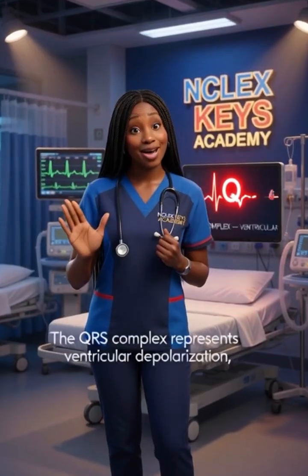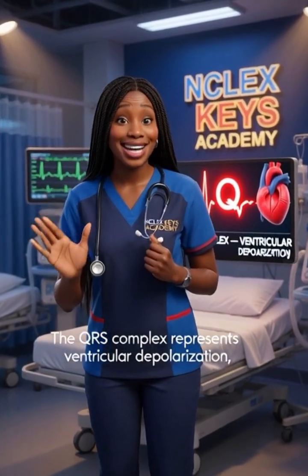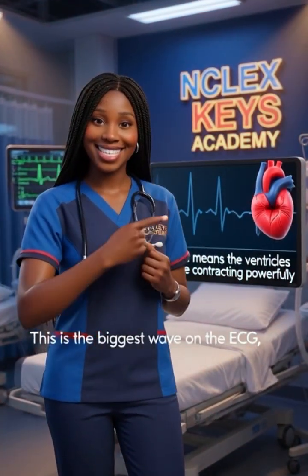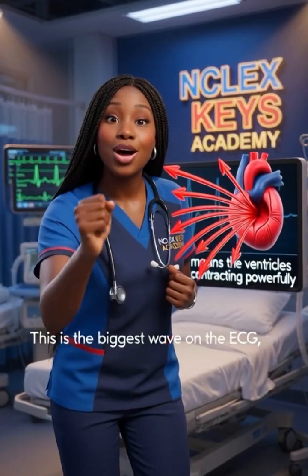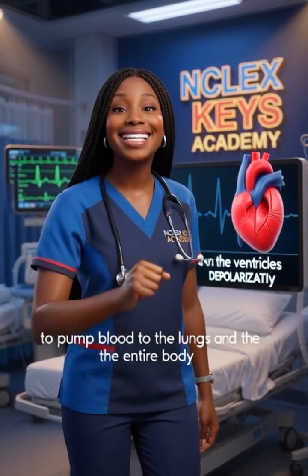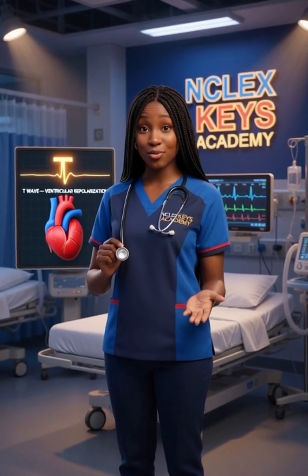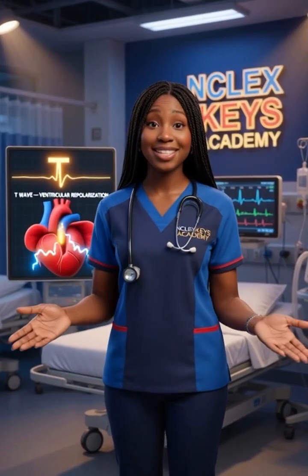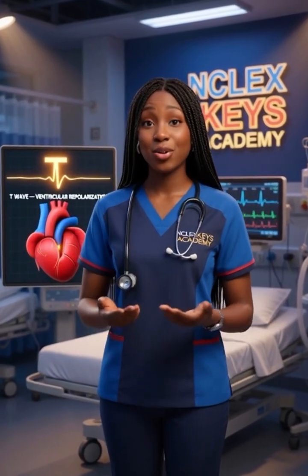The QRS complex represents ventricular depolarization. This is the biggest wave on the ECG. It means the ventricles are contracting powerfully to pump blood to the lungs and the entire body. And the T wave represents ventricular repolarization. This means the ventricles are relaxing and resetting electrically, getting ready for the very next heartbeat.